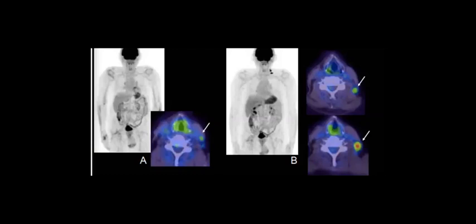So this patient has a known history of something, and he already took treatment and did follow-up, and this one was the follow-up, yes. And you can see that at the first follow-up he did after, for example, 6 months, he has maybe this lymph node, right? Do you agree? In the left side. Then when he did follow-up again after 3 months, what happened here?